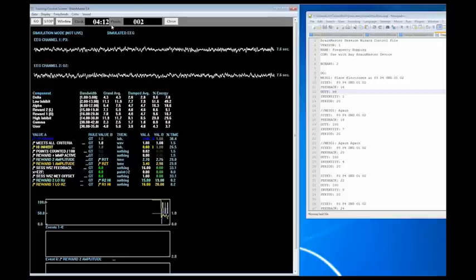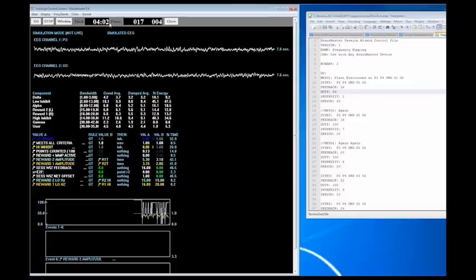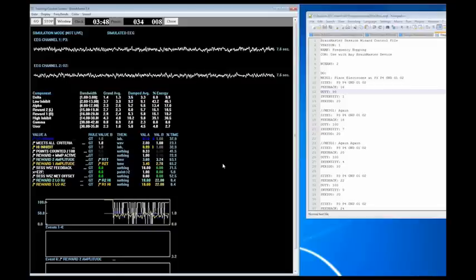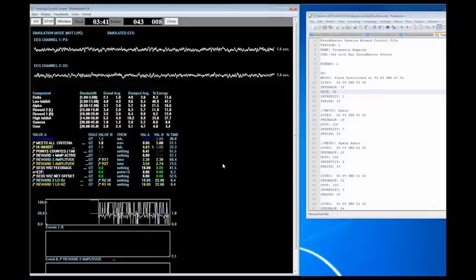So this is how it works. Now we're going to look at the time, and we're going to wait till we get to 20 seconds. Watch it change. 18, 22, 18, 22. So now we've changed our band length, or range, I should say, sorry. Now we're going to wait about 2 more seconds. There it is, 20 to 24.